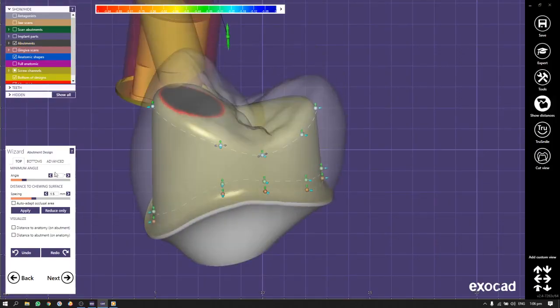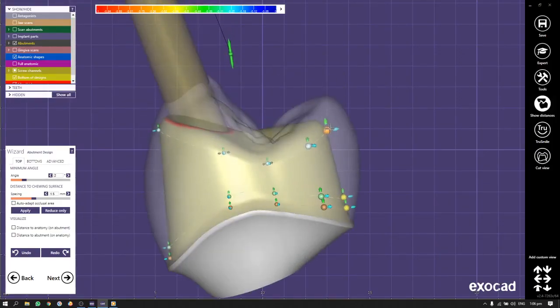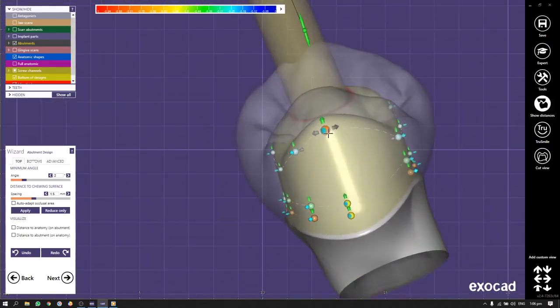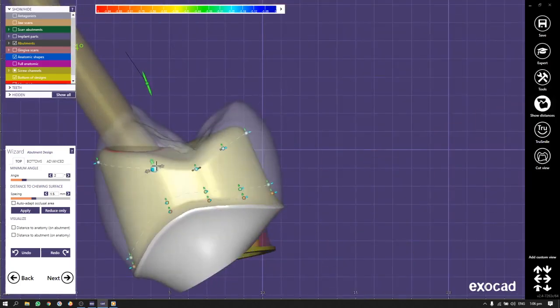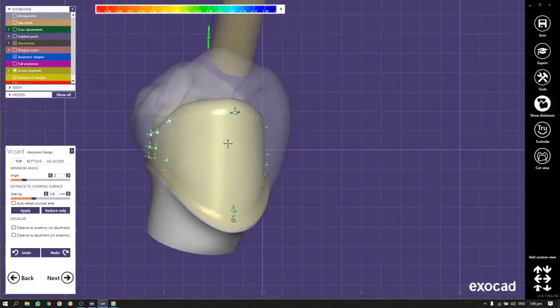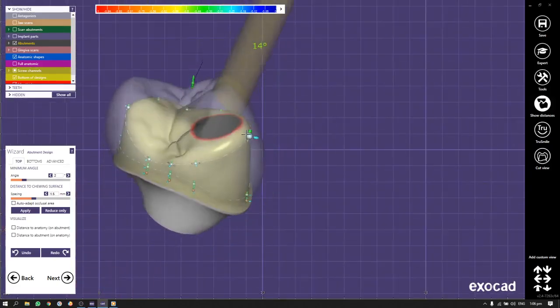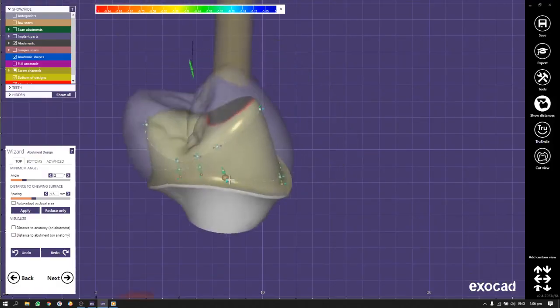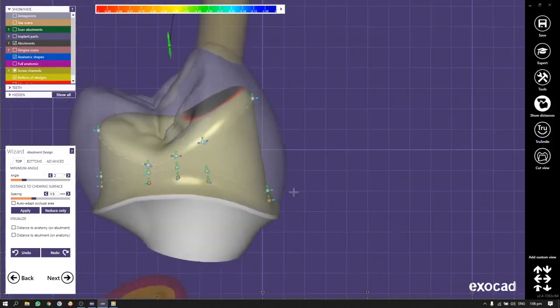Here you see the block 2 degrees. So more than 2 degrees, you couldn't make the expansion. No matter how you try it, you can place 0 or 4 degrees, but I'm working with the setting 2 degrees. It's one parameter that we need. Then I can hold with the control left mouse button and can make the finish line wider and more even on 360 degrees.